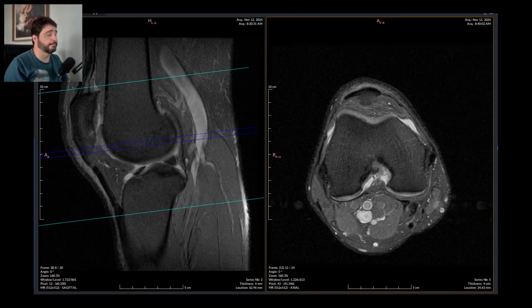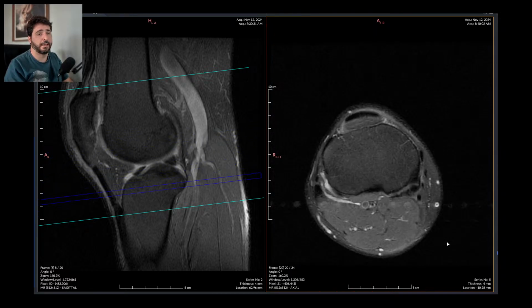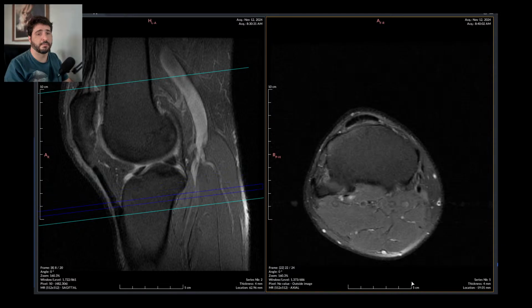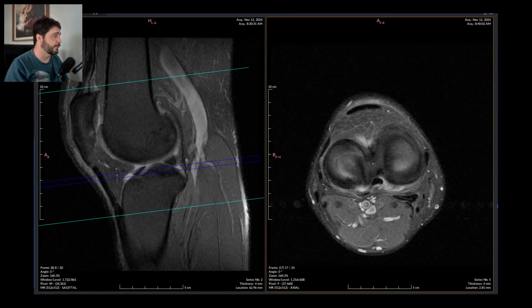Right there. Edema of soft tissue right there, right there. There is indeed some edema. It is a swollen knee. Meniscus are fine. Cruciate and collateral ligaments are fine. And this is it.